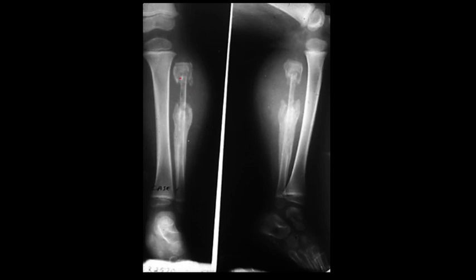So this cylindrical portion we're seeing from here to here, this area right in here, this is all the sequestrum. It's that sequestered or attempting to be sequestered necrotic portion of bone. It has calcified, so we can see where it's more dense. It kind of looks like it's just the medullary cavity continuing on where we lose the cortex.